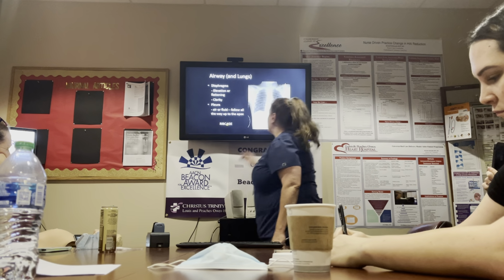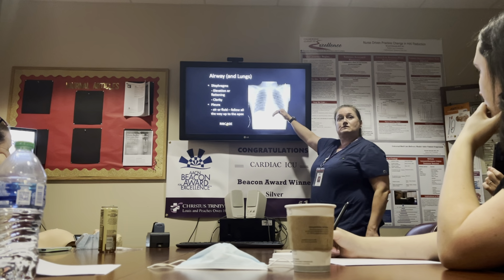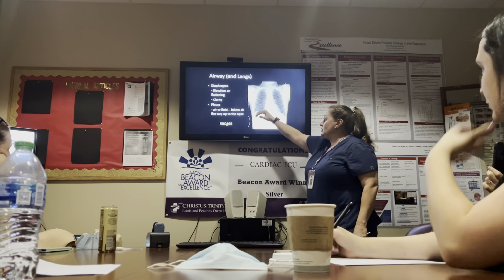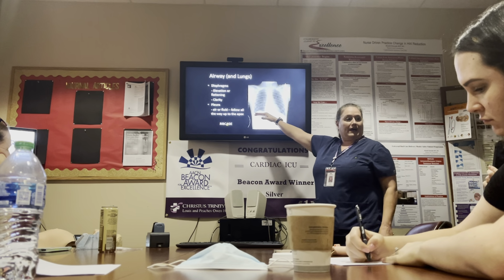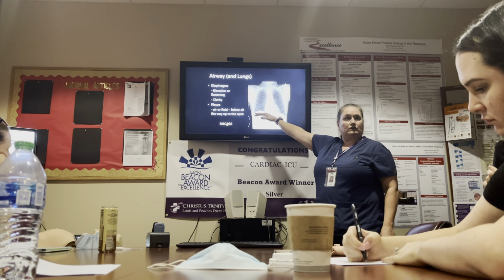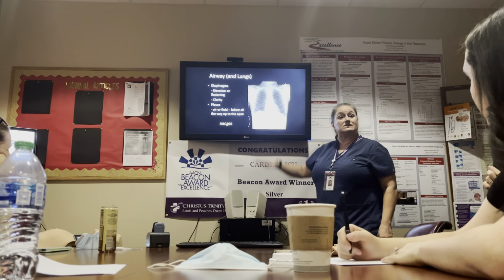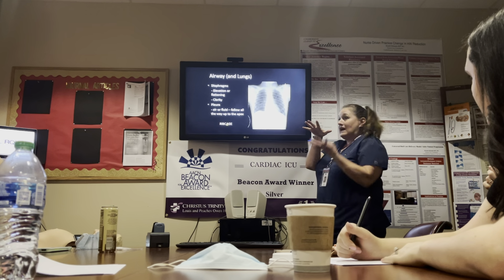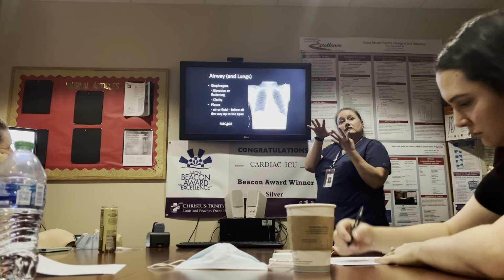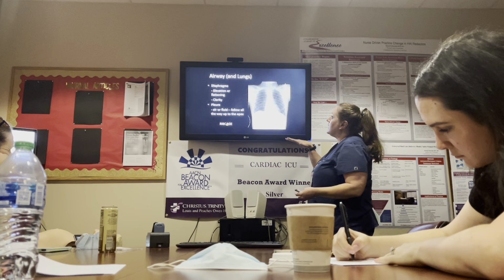Okay, you want to look at your diaphragms. Are they clean and clear? Do they look like a half moon? You want to see if there's any flattening. What does it tell you usually if it's flattened? Somebody who has COPD or bad emphysema, because their diaphragms don't work as well. Their lungs have pushed their diaphragms down, and the diaphragms can't move back and forth as easily because the lungs have pushed them out of the way.